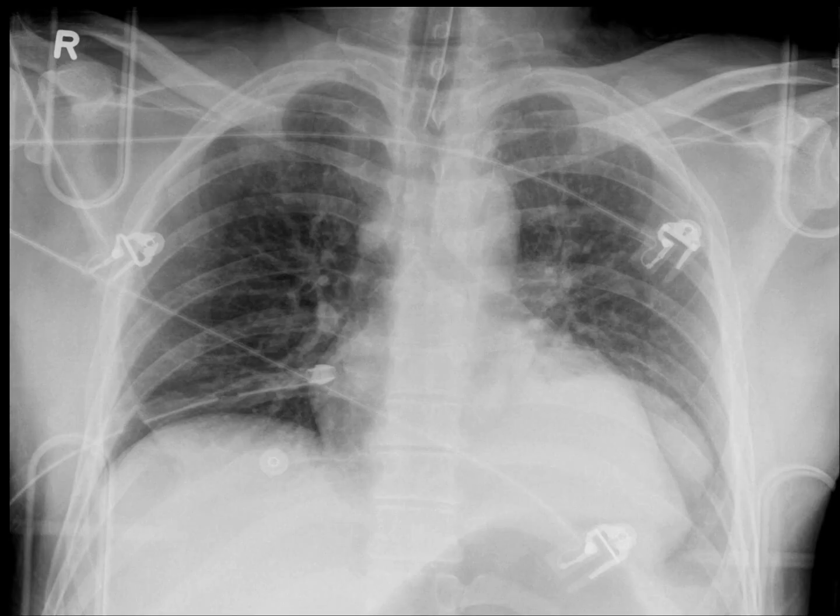Patient number 9, 50 years old, a motorcyclist, sustained a collision with a truck, was intubated, and received a thorax drain in the pre-hospital setting. Airway central, tube is okay. B, I think it's okay with the chest tube, and the two holes are in.